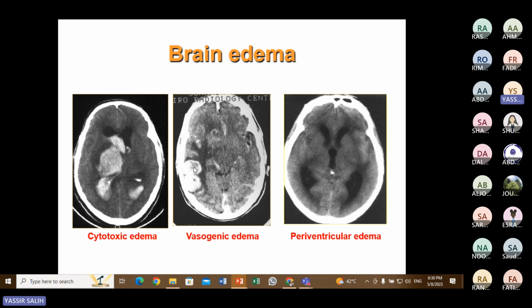Also this is a CT with contrast; you can see this is an enhancing lesion. Notice here we also have edema, but this edema involves the white matter and the gray matter is not involved. That is why it is called finger-like, with sparing of the gray matter. So this is vasogenic edema. Vasogenic edema occurs around space-occupying lesions, for example tumors or abscesses.